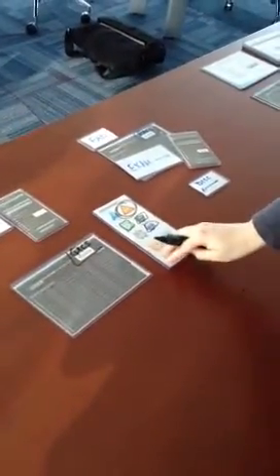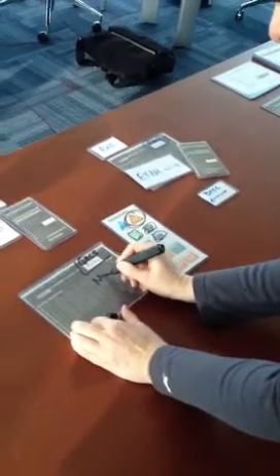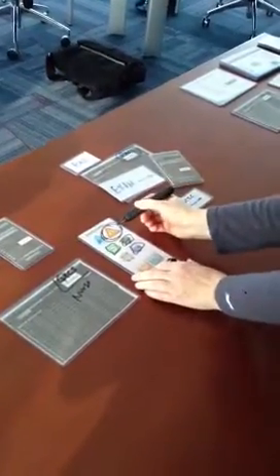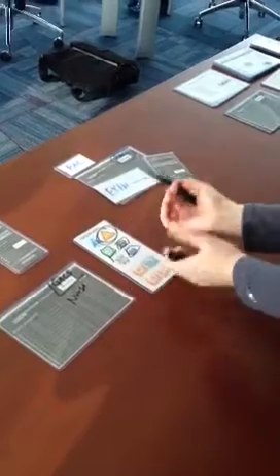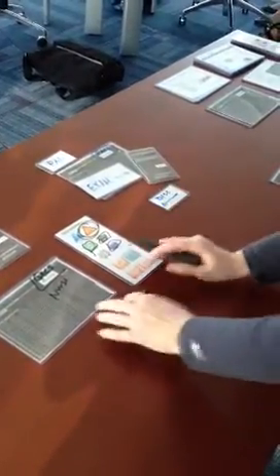So the discrepancy could be notified to, perhaps there's a charge nurse or a lead nurse that's watching this Quicks work list for communication, or the alert could be sent via text right to the doctor, the ED doctor.